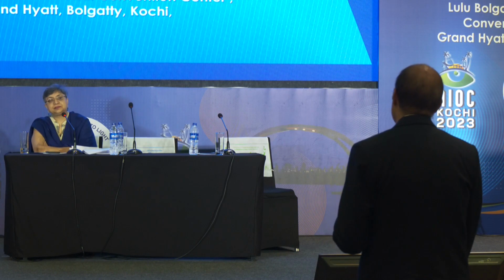If OCT is showing some change, then we take it as a change which could contribute towards glaucoma. That could be one factor which can be addressed. If you get that picture, then you can dig a little deeper: does he have sleep apnea or something else to account for that? And if it's there, we address that. It doesn't matter whether this is purely vascular or something else; the important thing is that we can offer something to the patient which can help him.